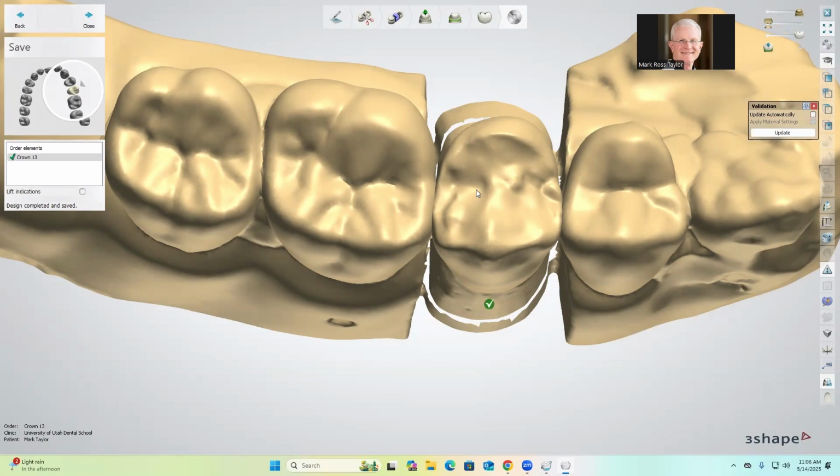At that point in time, you can open up and finish it, but your contacts are still there. Everything you left is there. It just might mean you have a couple more contacts you might have to thin out at the finished product. But don't hit no and ignore those minimum thicknesses. Hit yes to all.